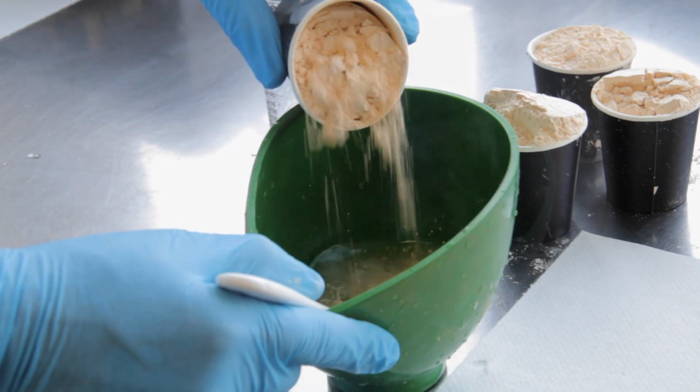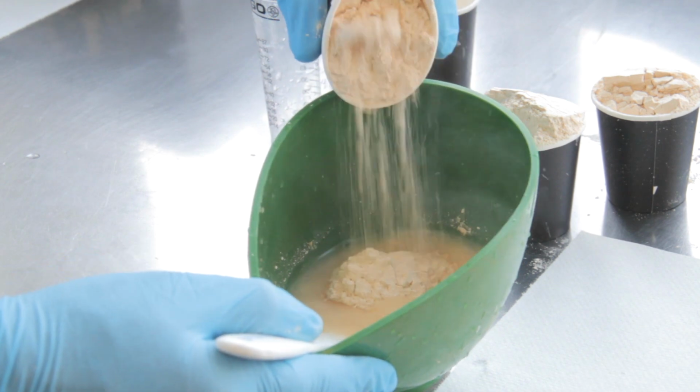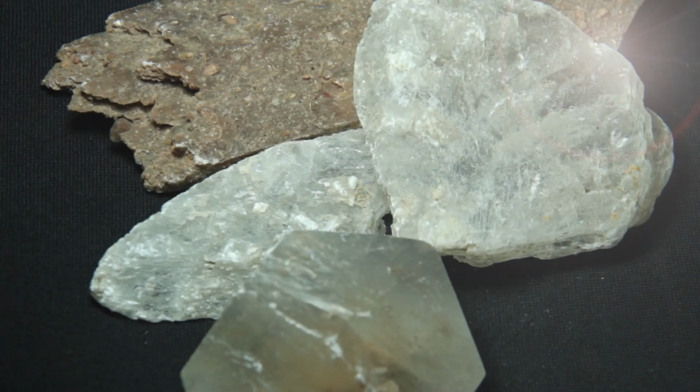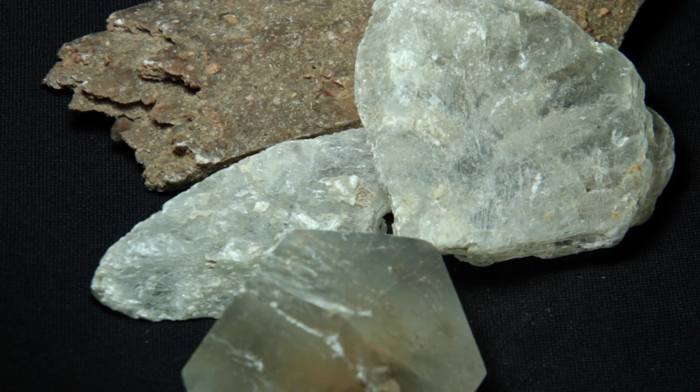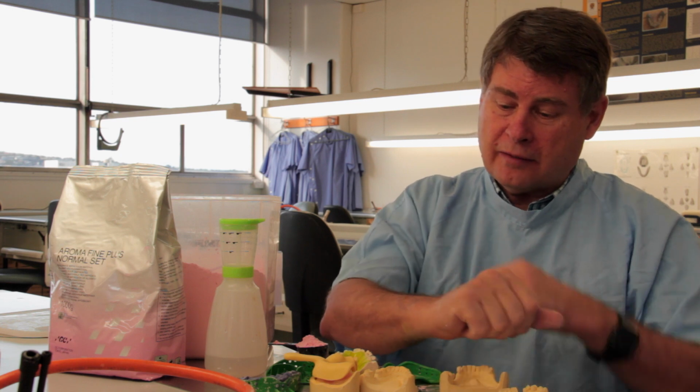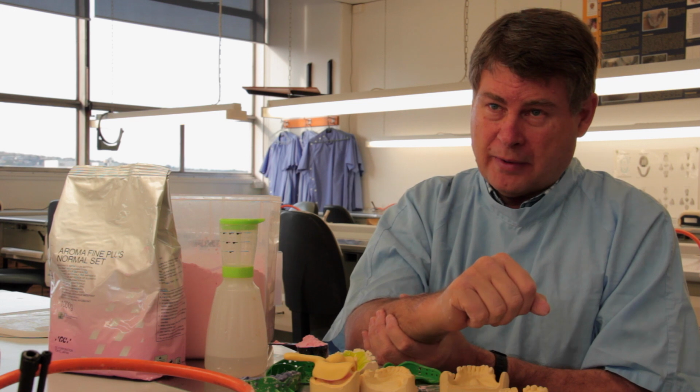To make the cast, mix water and plaster together. Plaster is made of a rock called gypsum, which you can find in New Zealand. Most of you will be familiar with plaster of Paris bandages, where if you've broken your arm, they wrap a bandage around that goes hard, and it's that white plaster of Paris bandage to help your arm set. Or if you go home inside your house, you've got gypboard, which lines the inside of your house, and all this is made from a product called gypsum.